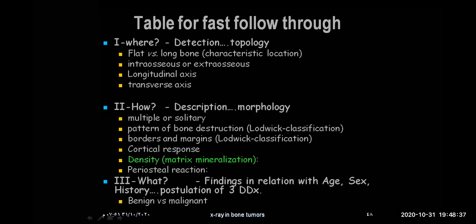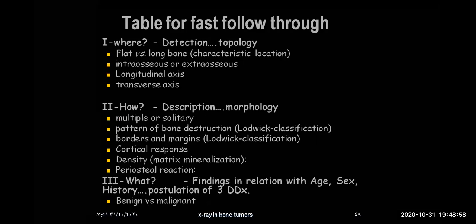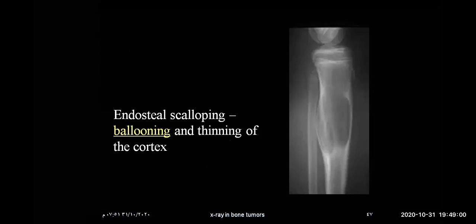The other thing is cortical destruction. And this is common in malignant tumors, what we call breach of the cortex or cortical breaking. You know? Cortical breaking or breach of the cortex. Okay.